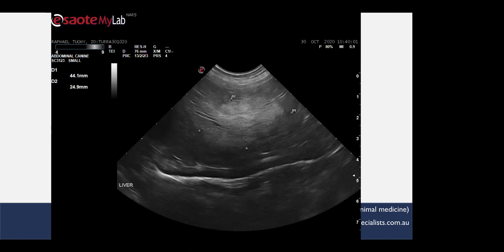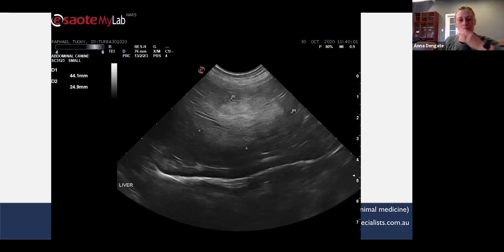So I was just going to ask, do you think that the rest of the liver looks mixed echogenicity? Because I guess that would draw you away from thinking this was a benign lesion. That's all I was saying. I actually thought this liver was quite smooth in echo texture, but I don't think I've got enough of it in this image to make that call. Knowing this patient, I thought the rest of the liver was normal in size, quite smooth in echo texture, and normal echogenicity, but it just had this bright lesion in it. Okay.